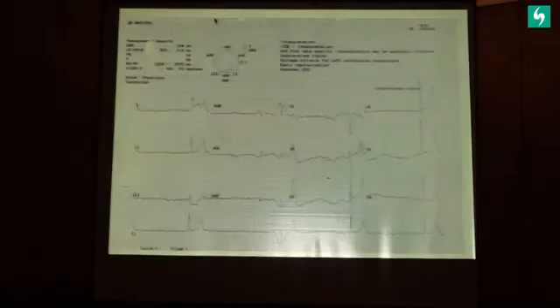Okay, this patient was a patient of atrial fibrillation, heart failure, on multiple drugs. Came with chest pain, and here, unfortunately, our emergency room diagnosis was an MI, hyperacute MI. Patient was shifted to the lab, but one thing which was missing is that the potassium level was not done. So you can get this hyperacute. This patient was on Aldactone, and his potassium at this stage was 7. So just correction of potassium was all that was needed to treat him.